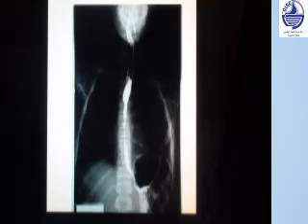Now we can see a barium swallow for a child. Usually, this X-ray is done if the child at this age has a post-corrosive esophageal stricture. When a child swallows corrosive materials that lead to stricture of the esophagus at multiple levels, we do this kind of dye study to find areas of stricture in the esophagus and how we can treat them. So to write a comment for this patient, we write it's a barium swallow showing stricture in the middle third of the esophagus, and he's a child, so it's mostly post-corrosive esophageal stricture.